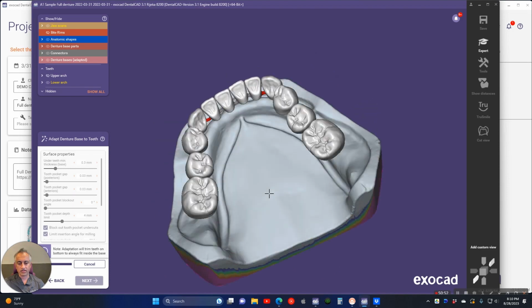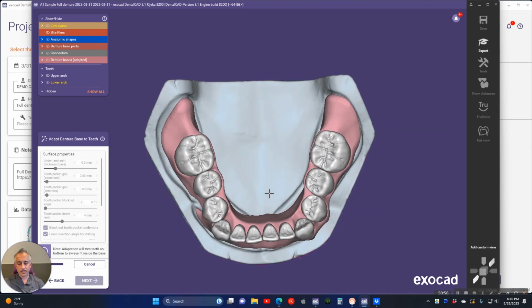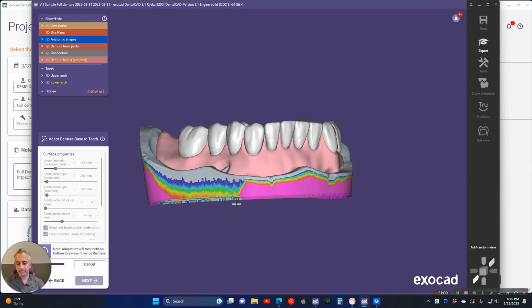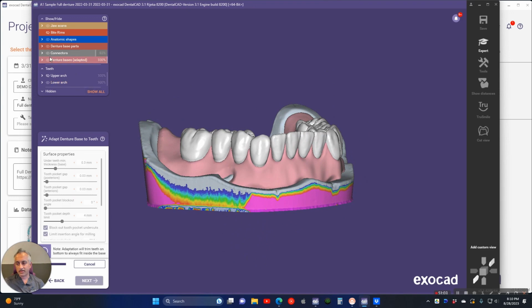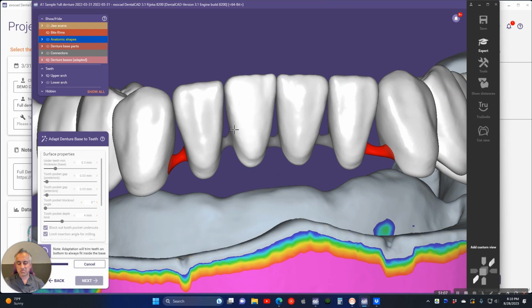And I think, again, most of this is probably from those connectors. I probably screwed something up. Oftentimes, I don't print with connectors at all. I just have the teeth connected. And with those connectors, I don't know if you noticed, but I had a lot of spacing above them, which is not a great design.